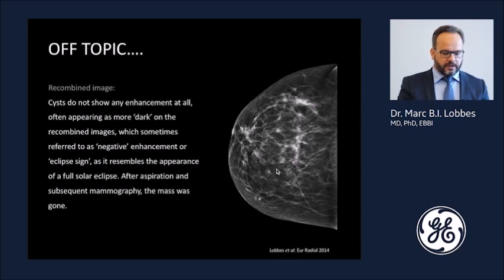So again, in this case we did do an aspiration, sort of in the light of teaching. We did do an ultrasound guided aspiration, and we did check it on a subsequent mammography, and you see that the lesion has disappeared, confirming that it was a cyst.